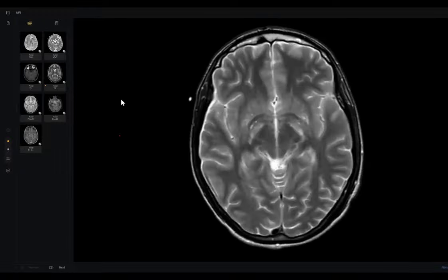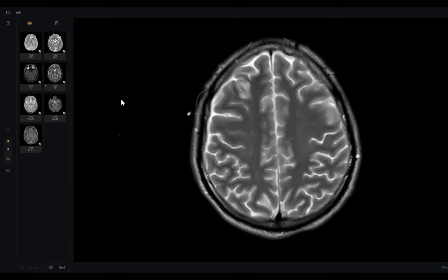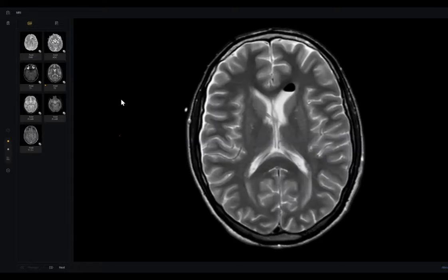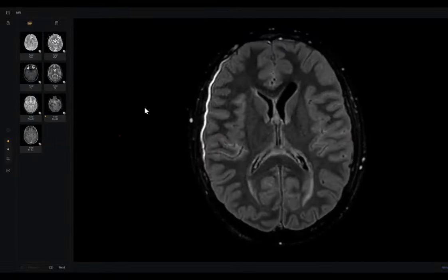No intracranial abnormality. Are you sure? Which sequence do you want? Only one sequence. FLAIR. Last sequence. Okay.